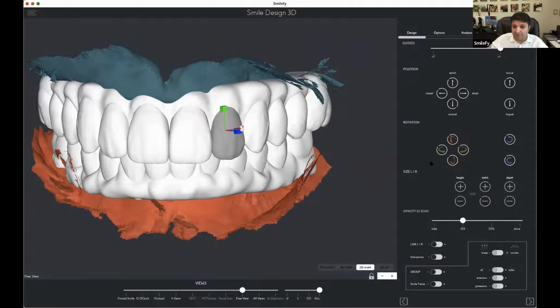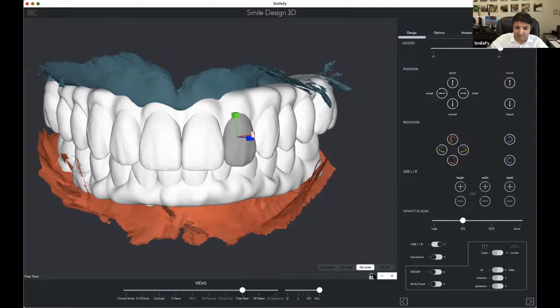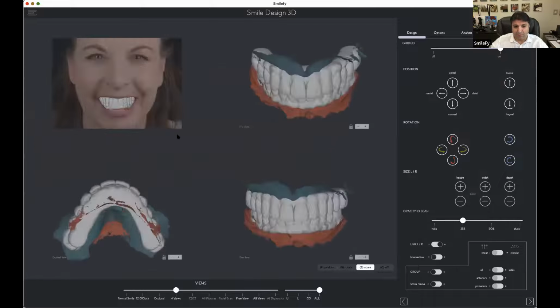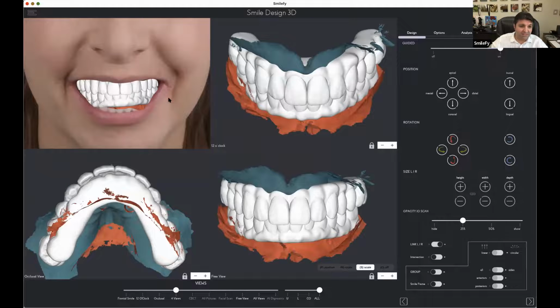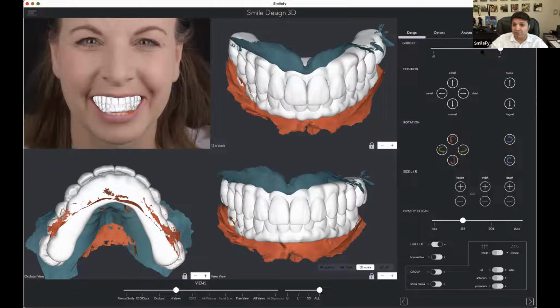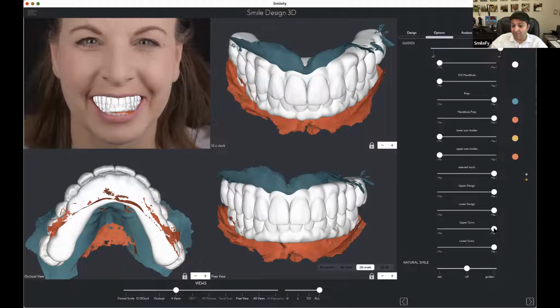Now I don't like the laterals, so let me make them a little bit more fun. Yeah, just a little bit, reducing the height, and everything looks much better. So of course, considering the face and the facial harmony and everything, that's gonna be a high priority for me next week, because I want this jaw really in the picture position.